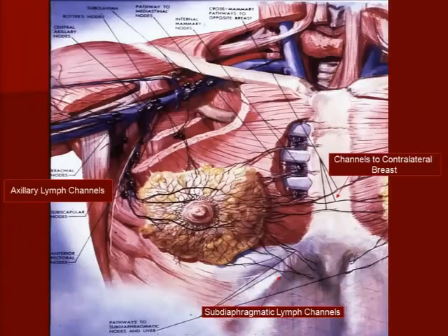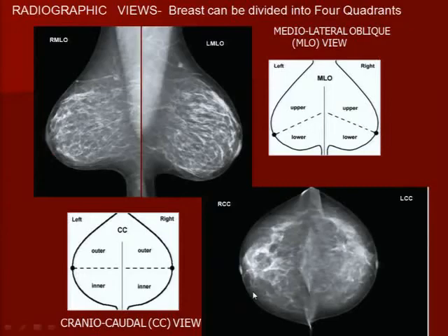It's very important. So again, you've got the anterior axillary group of nodes here, where 85% of it is from there. Then you have the one that goes across to the mediastinum and across to the contralateral side, the subdiaphragmatic one that goes to the abdomen.